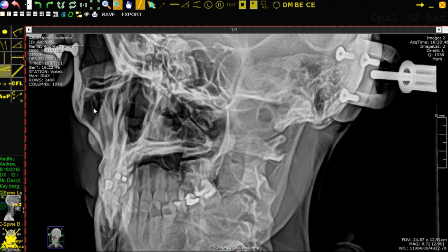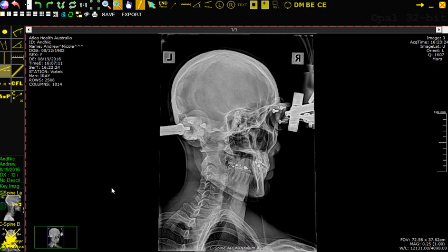And what we end up doing is measuring what this joint angle is, usually using the horizontal angle. So we do that on both sides here. And then we do that on the opposite picture, which would be right here.